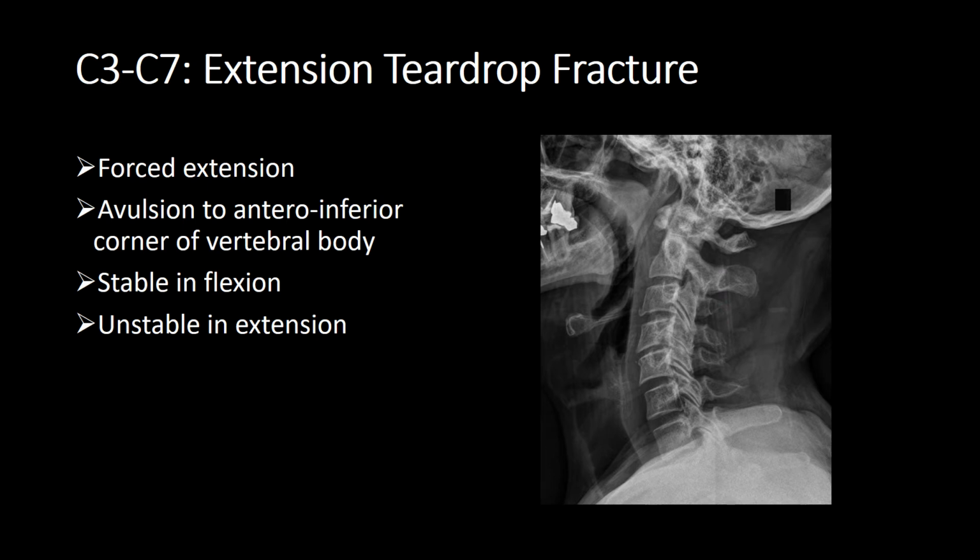So let's do bones. Okay. So we've got quite prominent mastoid air cells, but there's nothing going on in the skull. Nothing wrong with the mandible. Hyoid looks good. Anterior tubercle. Let's go around the odontoid process and C2. Let's go around C3. Yep, we've got disruption of the cortex. We have a fracture through the anterior inferior corner of the vertebral body of C3. C4 looks good.